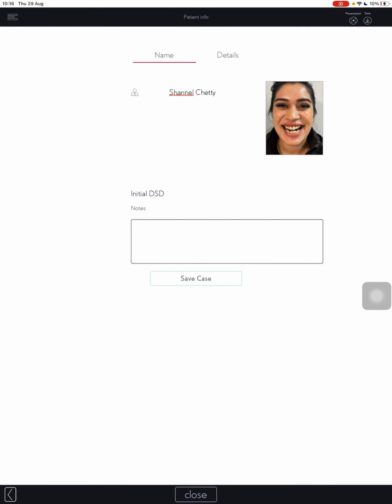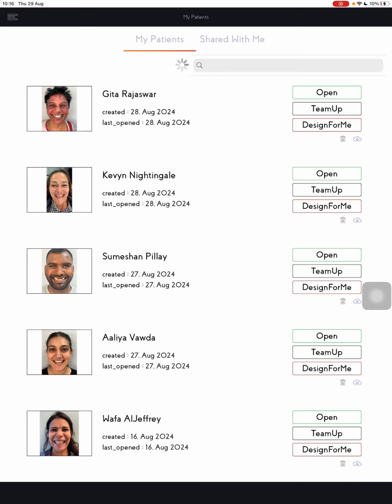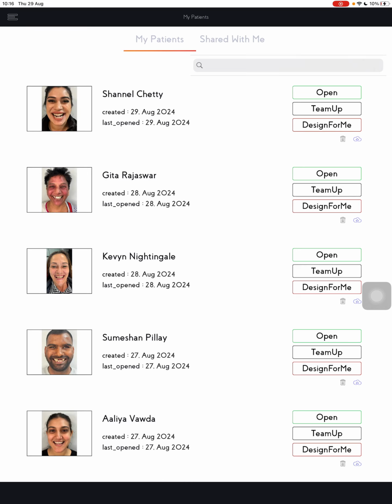And click on Patient List, and you'll see the patient saved, hopefully, in the list. And if you need to open it up again later, just click Open, and everyone can see it from that point of view.